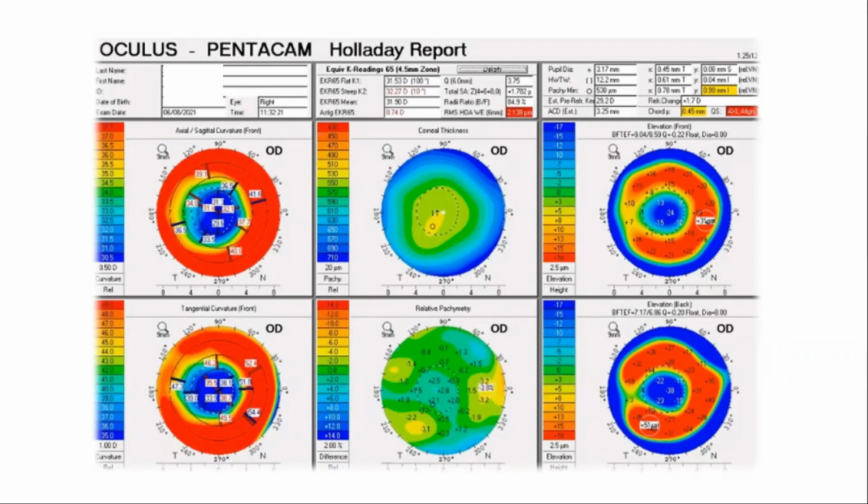So in EKR, what happens is the anterior corneal values are adjusted or back calculated for any deviation of the back surface power from normal. So here, Dr. Priya, this is similar to what the IOL Master 700 gives as the corrected K readings. It gives you the anterior keratometry and then it gives the TK, right? Total keratometry.